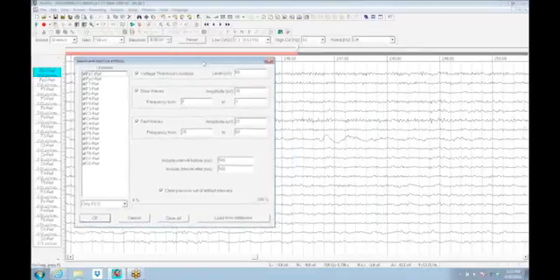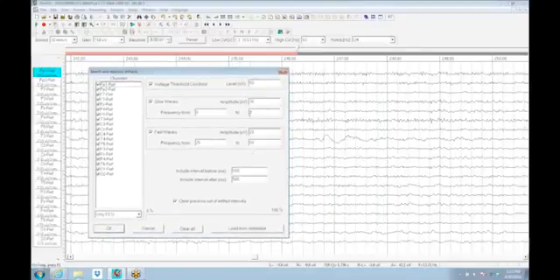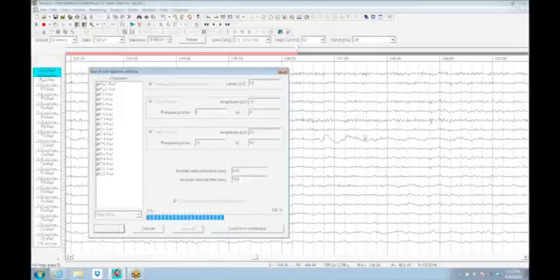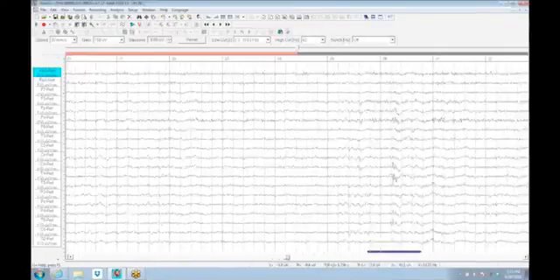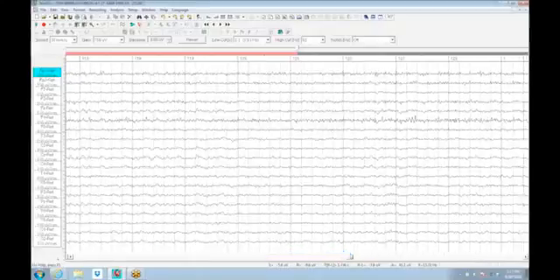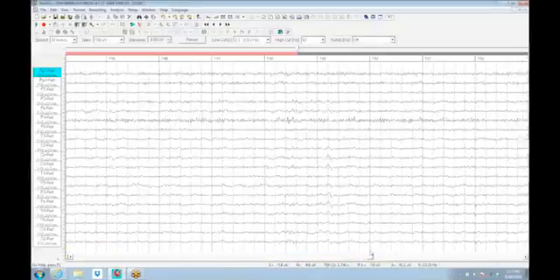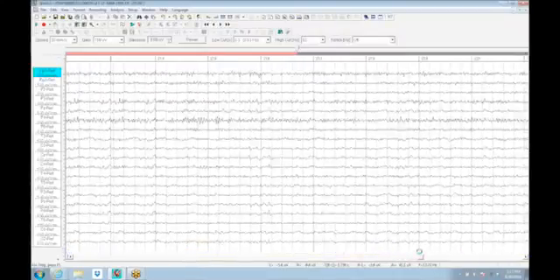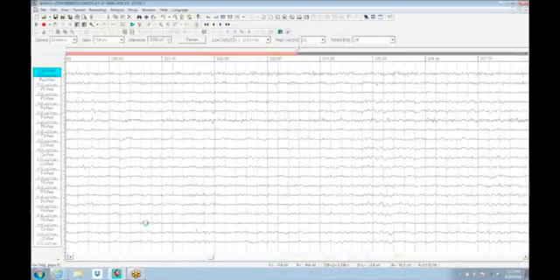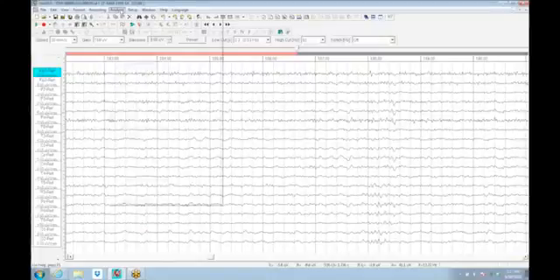And in all likelihood, this may be just a little above this 3 hertz bottom end. It may be a 4 hertz rhythm or so, and we can catch that by broadening the frequency bin too. But once you've got them fine-tuned to the point where you're catching the pieces that you want, and you're not getting rid of pieces that you want to keep, at that point you've got it adjusted. You can then do an analysis.